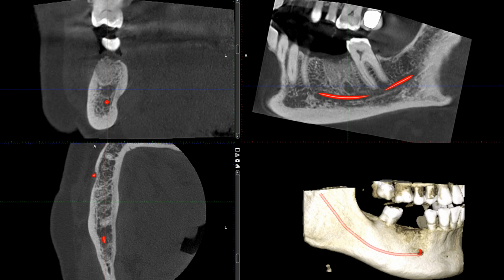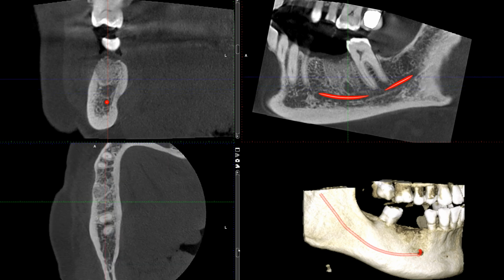In this video I would like to show you a very prominent marrow space that's captured in CBCT. Interestingly, this site also happens to be an area of interest for placement of an implant, where tooth number 30 has already been extracted and also grafted. So why don't we take a look at that first, and then we'll look at the site of marrow space.